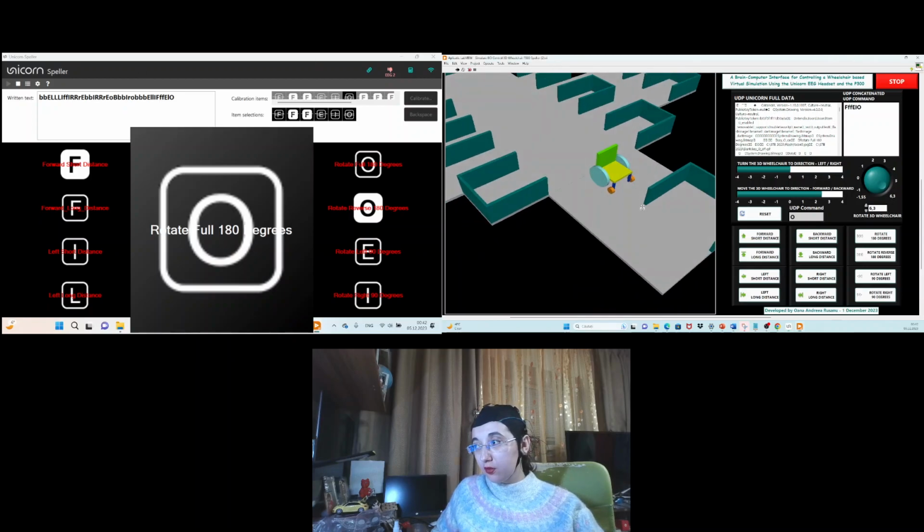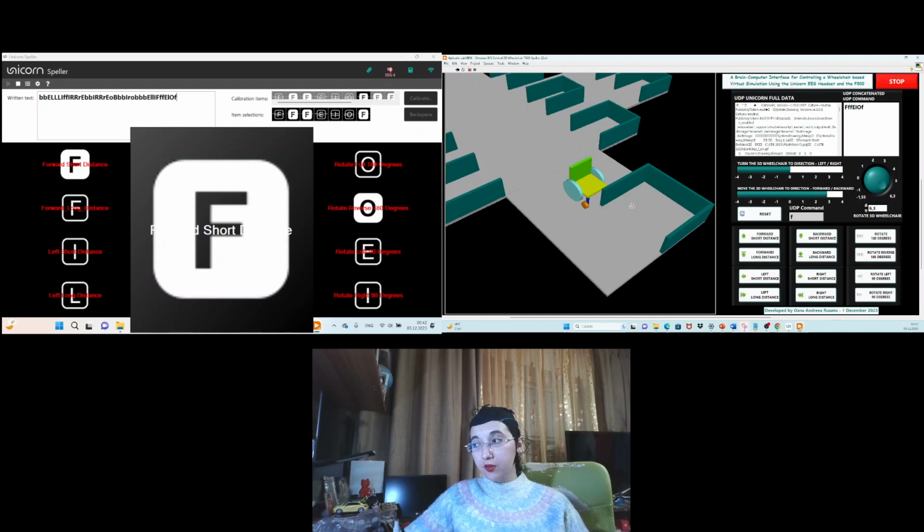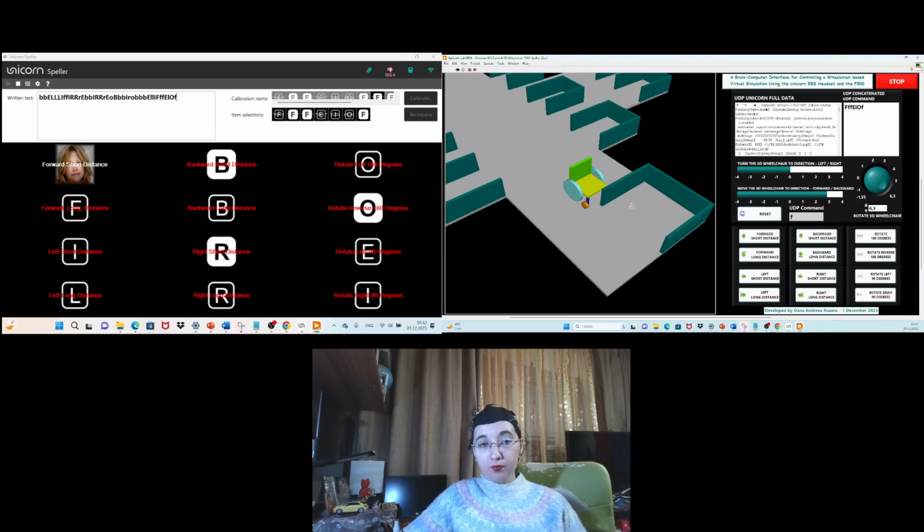Let's adjust. Forward short distance was executed. Again.